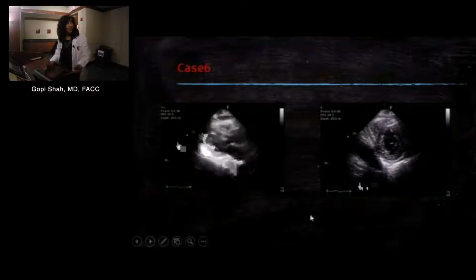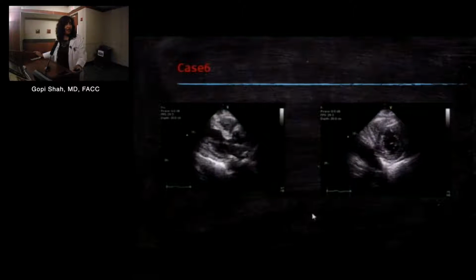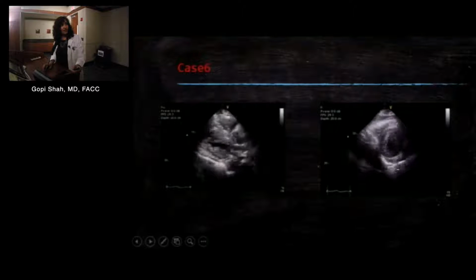Again, this was a patient, a mid-60s gentleman, who presented with chest pain, and it felt like this could be acute MI. Echo was done, and what was surprising to see here was that there is an anterior collection and the RV is collapsing. And whenever you have something like this and a chest pain, you want to make sure you look at the aortic root. It looks a little dilated, but honestly, on this view, I did not see any obvious concern for a dissection.